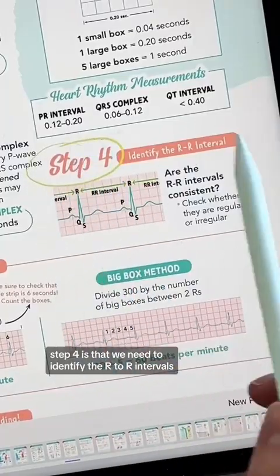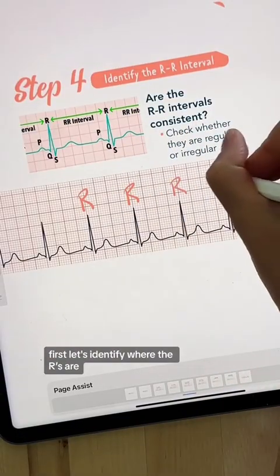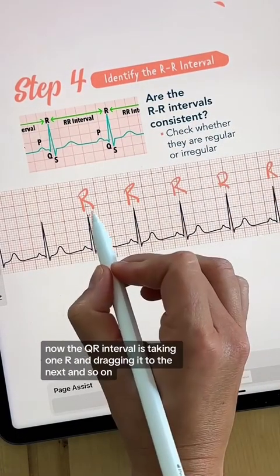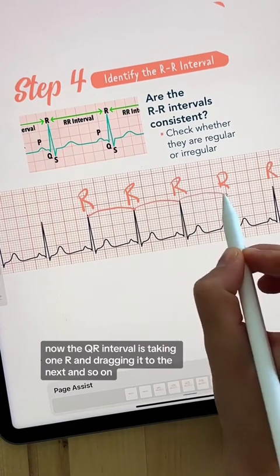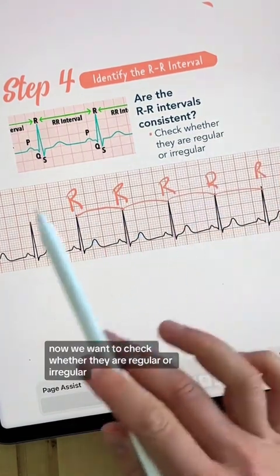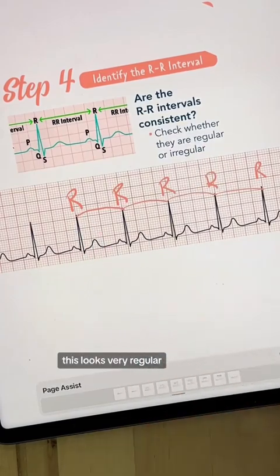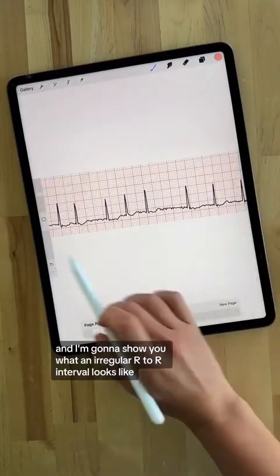Step 4 is that we need to identify the R to R intervals. First, let's identify where the R's are. Now, the R to R interval is taking one R and dragging it to the next, and so on. Now, we want to check whether they are regular or irregular. This looks very regular, and I'm going to show you what an irregular R to R interval looks like.